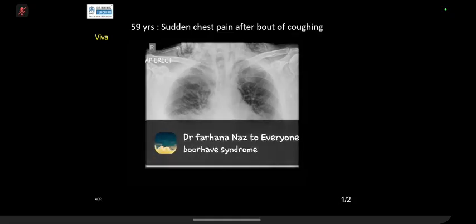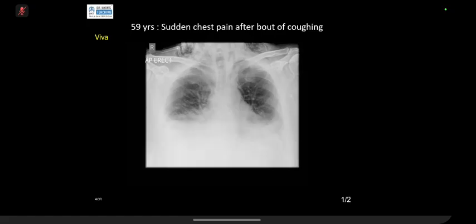Perforation. This is Boerhaave syndrome. It is horrendous, and if you see it philosophically, an absolutely healthy patient. And this can be fatal. I've seen three deaths here.